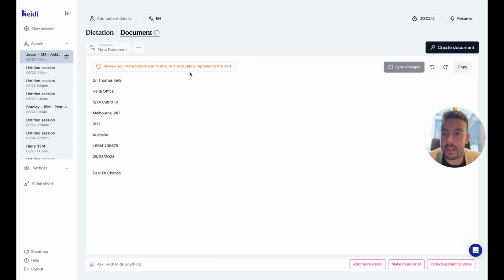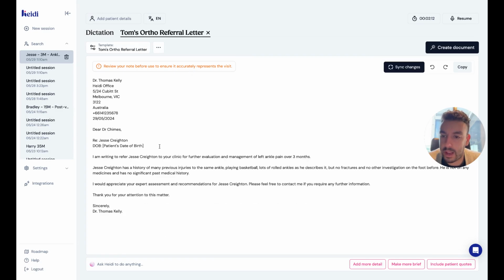And now what's going to happen, Heidi's going to go ahead and stream out this. So you can see now it's included this section. It's included today's date. It's got all the relevant sections. Thanks for your attention to this matter. And it's simplified the note based on the sections that we've included.